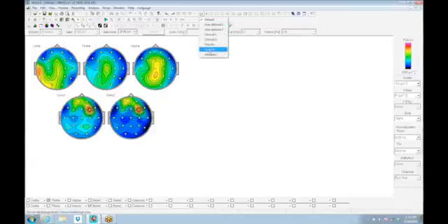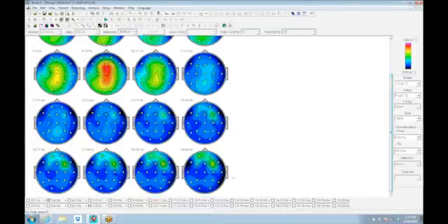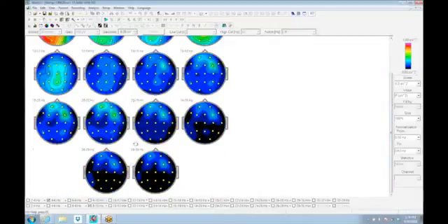But we can also get 1 Hertz bin mapping, and the default can be set starting at a different frequency. Here's 4 Hertz at the bottom end and 20 Hertz at the upper end. But you can shift those numbers around as you create different ones. And going with 2 Hertz, we're going up to 30 Hertz only. But again, you can print a set of them for a lower and a set of them for a faster frequency simply by doing some user-defined frequency bands.